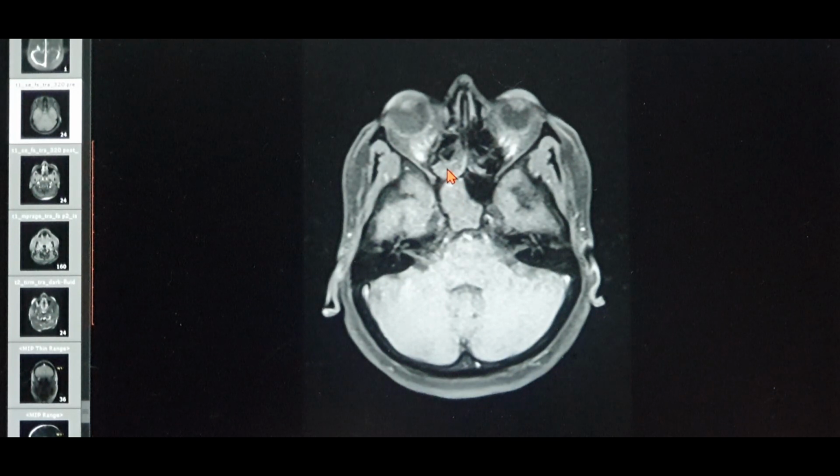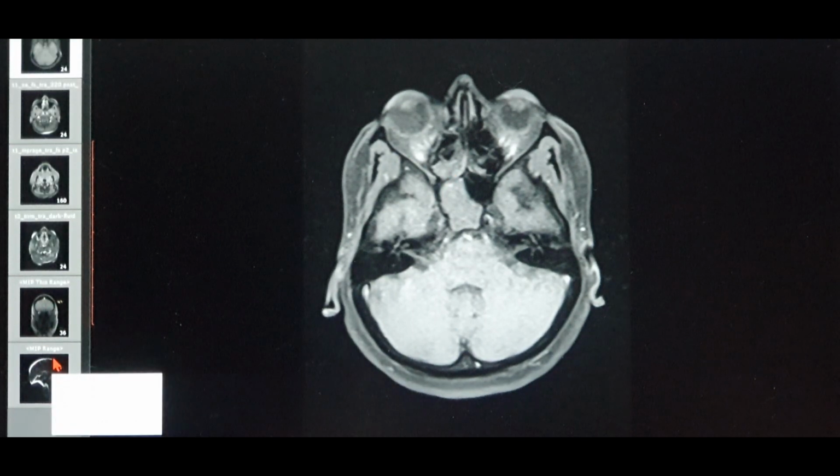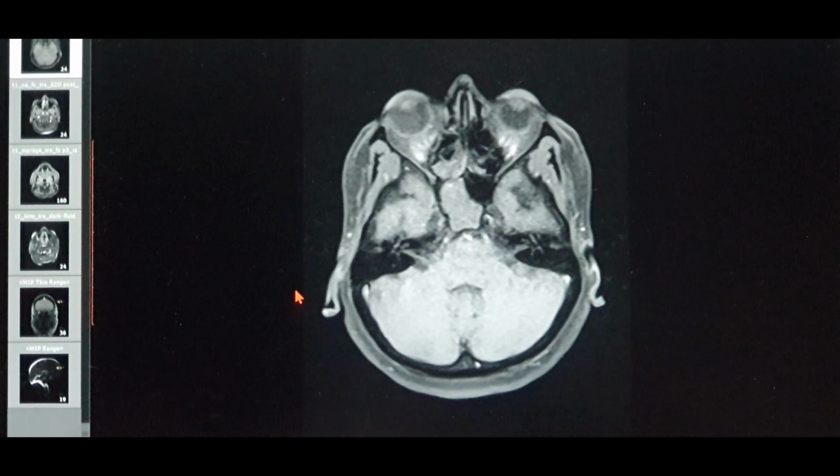So this is how you get to know the basics in MRI. So this is winding up the basics of the T1, T2, post-T1 contrast, FLAIR, diffusion weighted images. Now moving on to also the basics of how you can see the bone, the air, the fat, the inflammation, the gray matter and the white matter on the different scans and sequences.